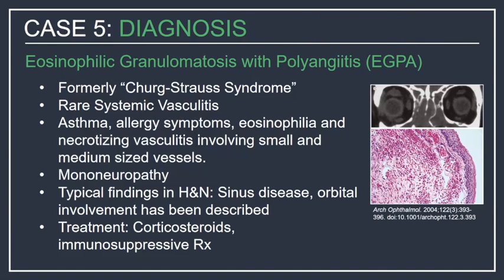So based on the presence of the underlying rash, the sinonasal disease, as well as the extraocular muscle enlargement, our rheumatologic colleagues were favoring a diagnosis of eosinophilic granulomatosis with polyangiitis, formerly known as Churg-Strauss syndrome. This was biopsied, and this was consistent with EGPA.